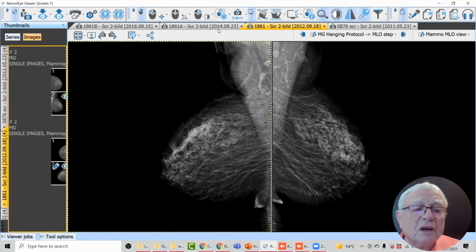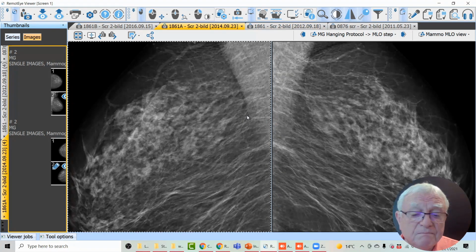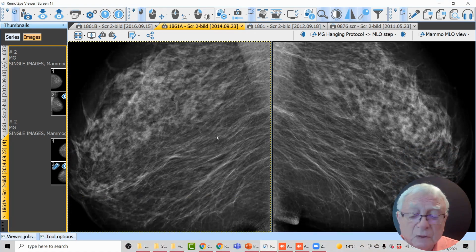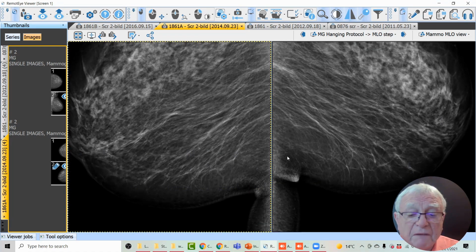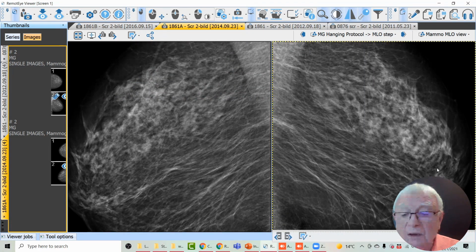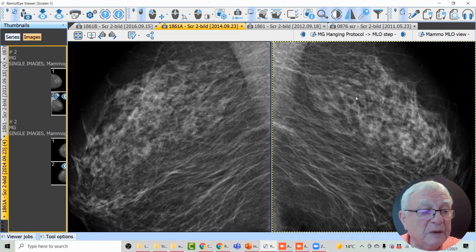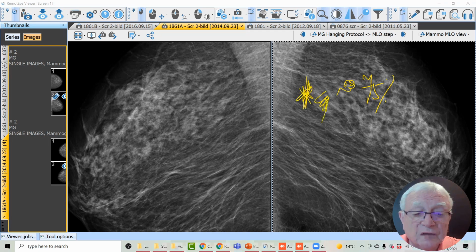Prove it. She comes back 2 years later. And 2 years later, her mammogram looks like this. These are TDLUs. The lower half of the breast very early loses the TDLUs. That's why the nipples go down. That's why most of the breast cancers originate in the upper half of the breast, because most of the TDLUs are here, and 75% of the cancers originate from the TDLUs. So it's only natural that most of the cancers are in the upper half, circular or stellate.